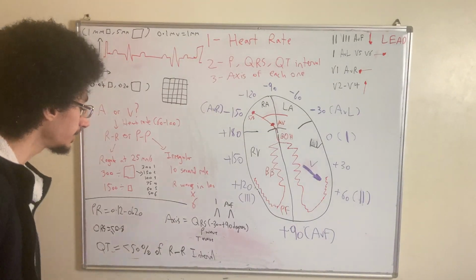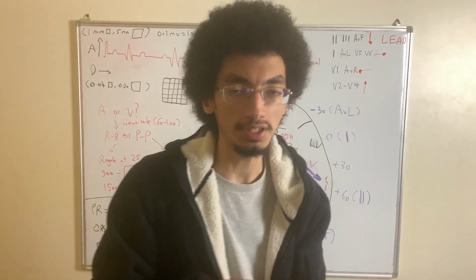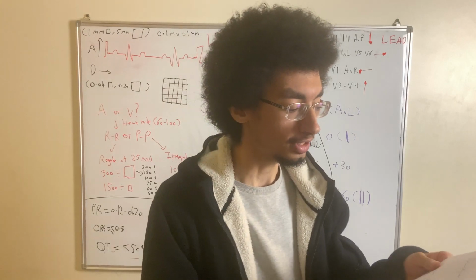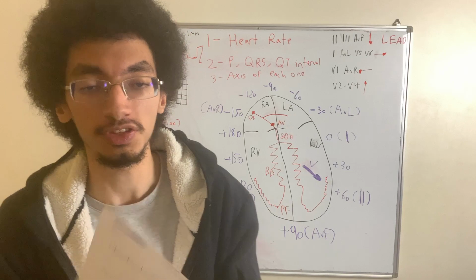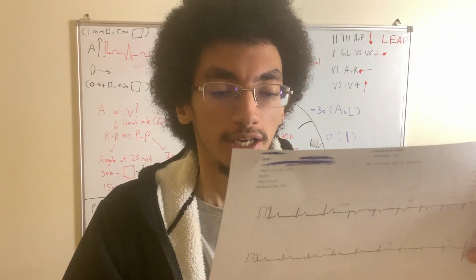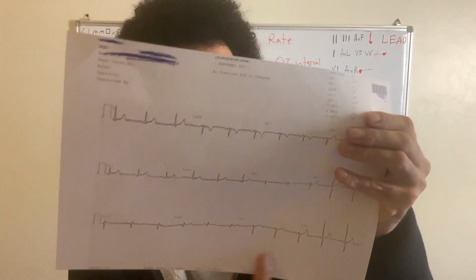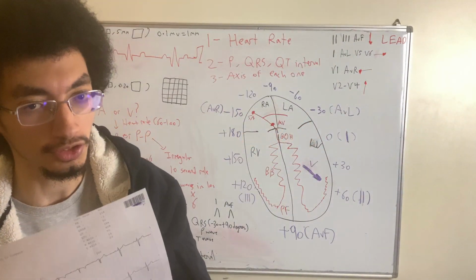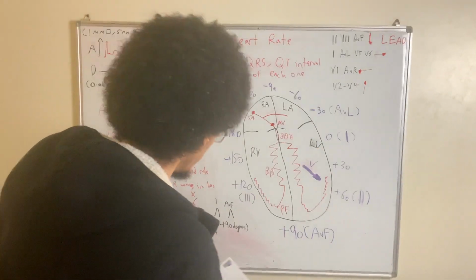The reason is that not all of the leads are shown from the left all the way towards the right side of the paper. More commonly, you might find just one lead, for example lead 2, shown at this angle and at this angle. Lead 2 will show you the entire rhythm strip across the whole paper in a 10-second strip. In this paper it won't show it, but you might find it.